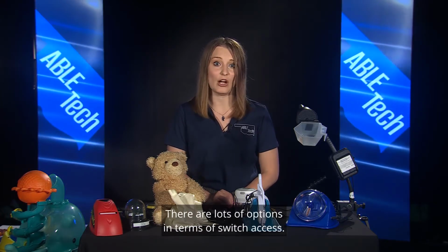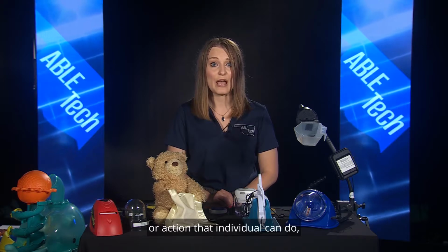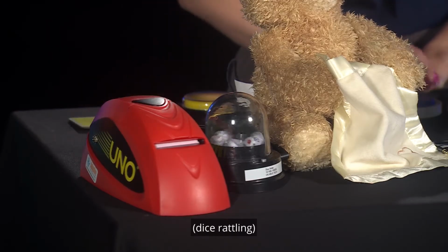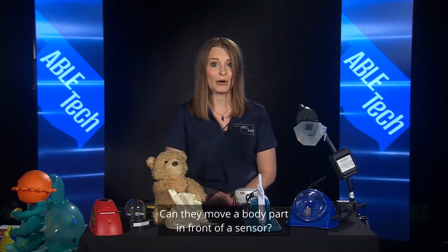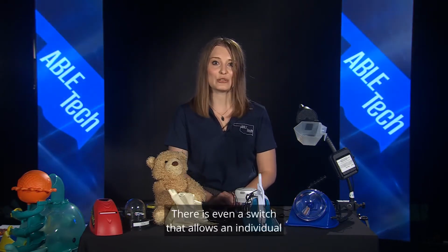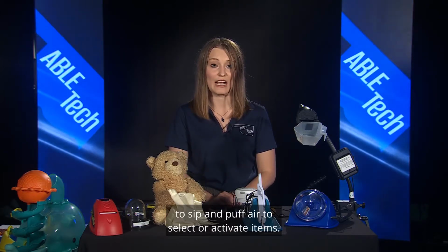There are lots of options in terms of switch access. If you can think of a movement or action that an individual can do, I bet there's a switch he or she can use. Can they simply lay their hand on a pad? Can they vocalize a sound? Can they move a body part in front of a sensor? What about moving their eyebrows? There is even a switch that allows an individual to sip and puff air to select or activate items.